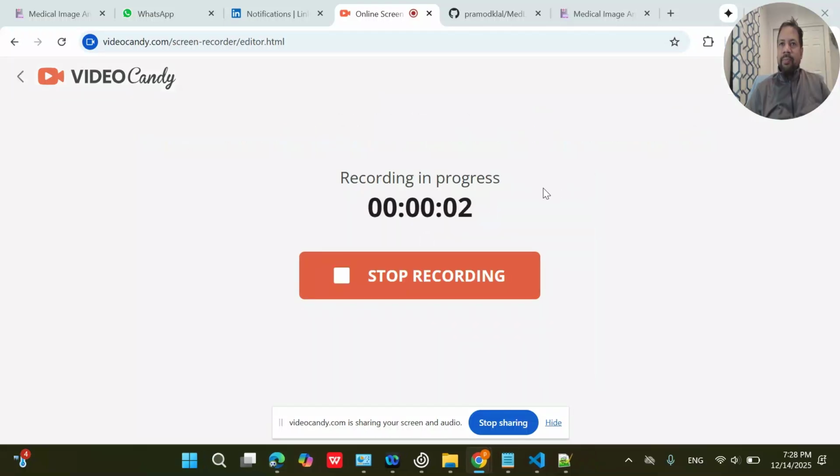Hello everyone, I am back again with one of the latest tools developed by me using LangGraph and the Gemini 2.5 Flash model. This tool is again related to the life science and healthcare area. I'm trying to help a doctor on a day-to-day basis. In his daily routine, he has to scan so many images. It could be X-ray, MRI, CT scan, anything.